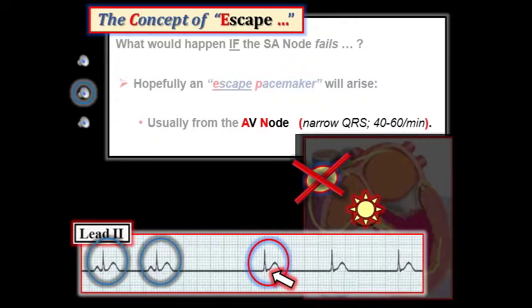Beyond the core, these small, subtle differences in QRS morphology, when they are present, may sometimes help to distinguish between sinus-conducted beats versus beats from some other escape focus that arises from within the conduction system.